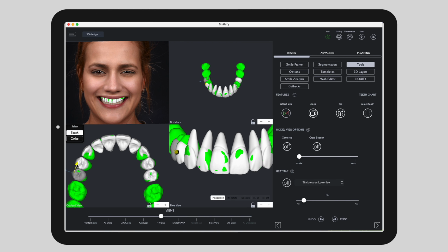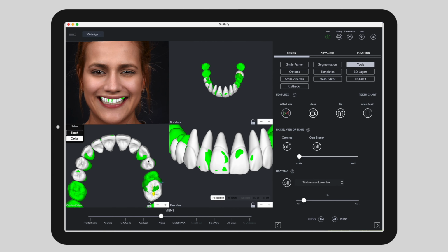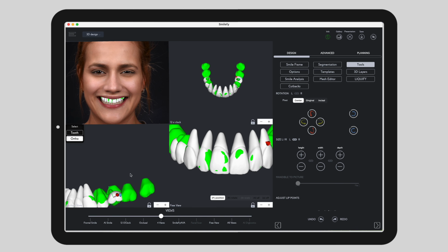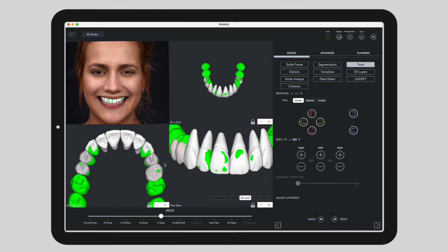Fine-tune tooth positions with both targets in mind. With both references visible, adjust each tooth slightly along the occlusal curve. Make small corrections to angulations if the aesthetic outlines require it. Ensure the incisal edges follow the planned smile arc. Harmonize width and length proportions with the AI outlines.